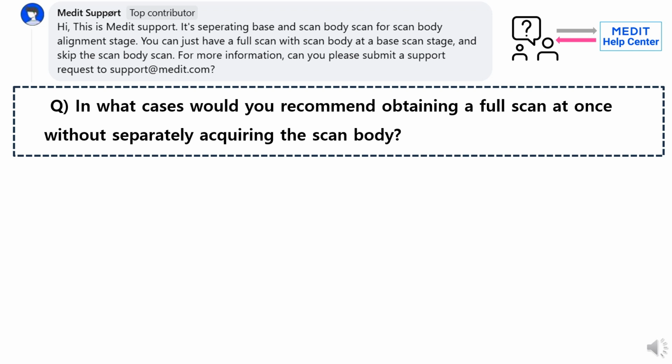Medit's response to this question was that you could just have a full scan skipping the scan body scan. I think scanning the scan body simultaneously with the arch scan can sometimes be simpler and more convenient. Then, when should we choose a workflow that scans separately, and when should we opt for scanning the scan body simultaneously?